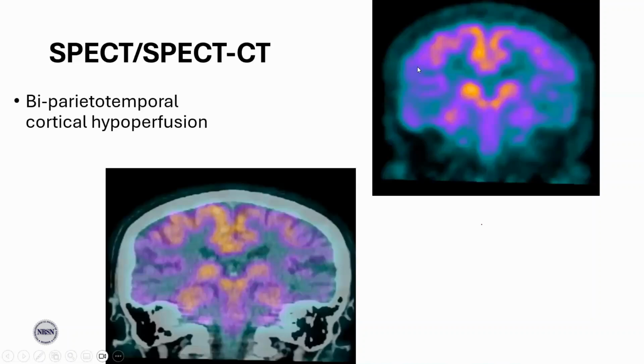Now, the parietotemporal regions bilaterally don't show color, which is in keeping with biparietotemporal cortical hypoperfusion.